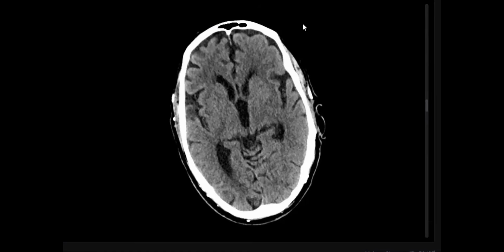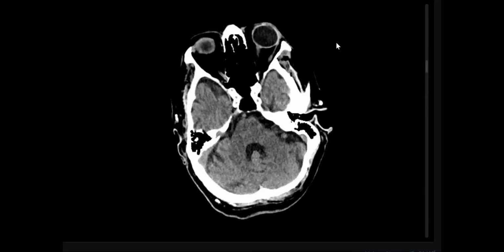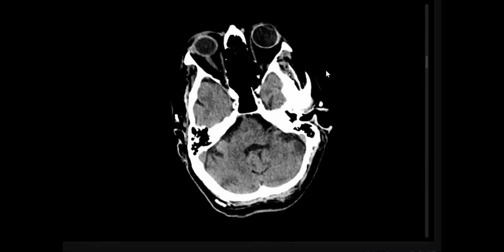Okay, right-sided hemiplegia. But in general, my friend, just a general question. If you face a normal appearing CT scan of the brain, because involutional change is considered normal for age, what are the hidden areas you are looking for?